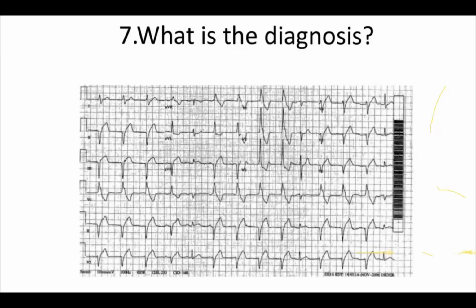When the next beat comes from the ventricular ectopic, the ventricle is in the refractory period. We know that cardiac muscles have a refractory period. So that's why it doesn't produce a ventricular ectopic beat, but a normal QRS complex. This is called the capture beat, right? Sometimes part of the ventricle will be depolarized by the ventricular ectopic and part from the upcoming sinus beat. That is called a fusion beat.